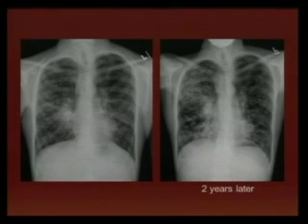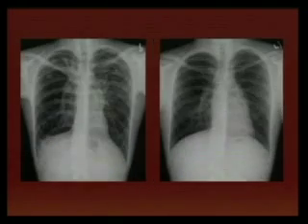This is something that can be seen in many diseases involving the bronchi. So when you have multiple bronchiectasis, there are some prominent hilar regions because there is a transient or a permanent pulmonary artery hypertension. That is correct. This is another case with a history of cystic fibrosis, and you can see involvement of the lungs, left greater than right.